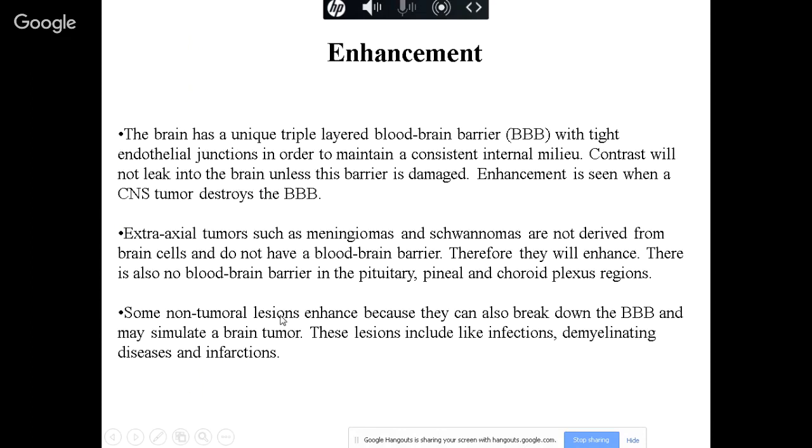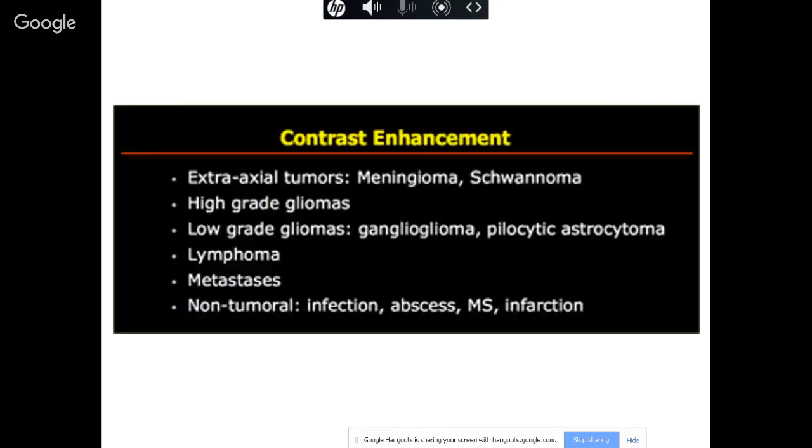Yeah, subacute phase. You need to know the timing. So when you look at them in the acute phase, they may not enhance. After 3 to 7 days, they start to enhance. Enhancement lasts for 1 month, and then disappears. All right? So, contrast-enhanced tumor: high-grade glioma, low-grade glioma.